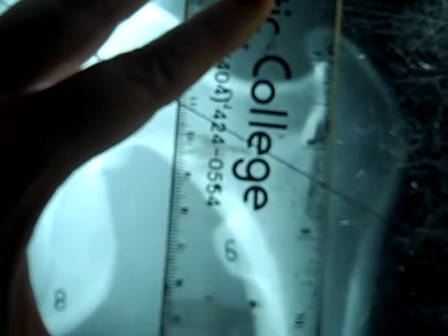Let's see, you're not seeing what I'm looking at. I'm looking down here to line up the mid-shaft portion of the femur, and I am drawing a line right along there. Now, when we measure this, we're going to measure the angle that is right here. And so I'm going to find my protractor, and I will put the base of my protractor along one of the lines. I will put the hole of the protractor at the junction of the two lines, and I am measuring from right here all the way to right here.